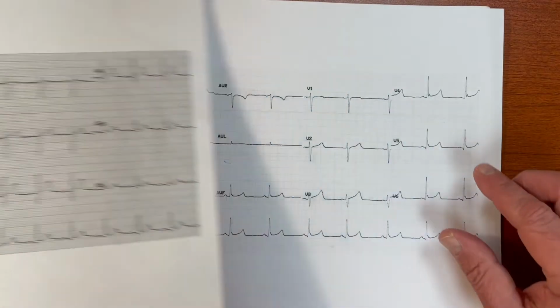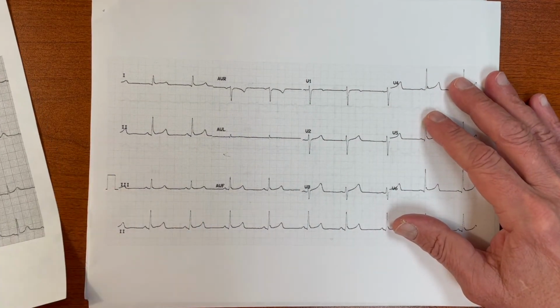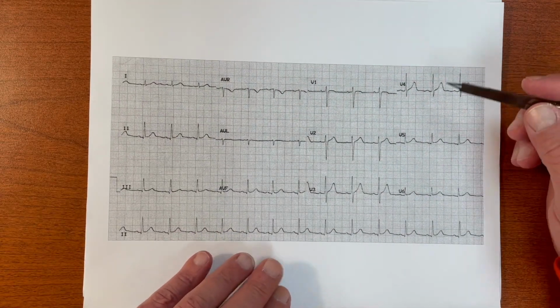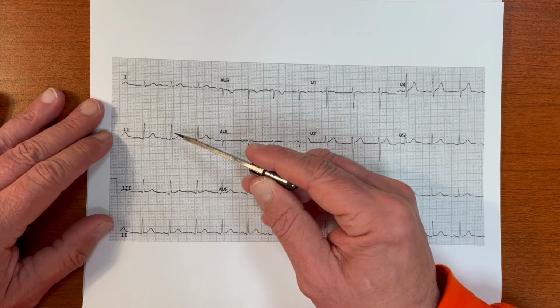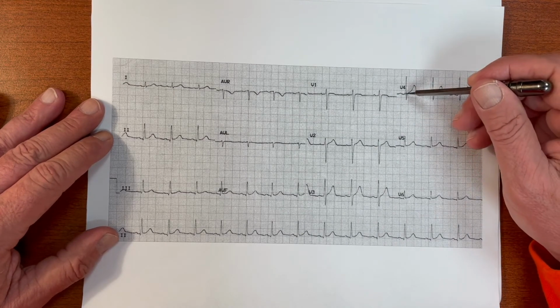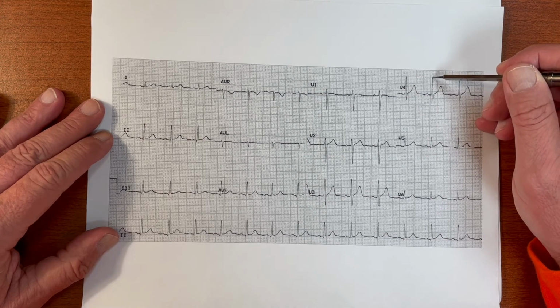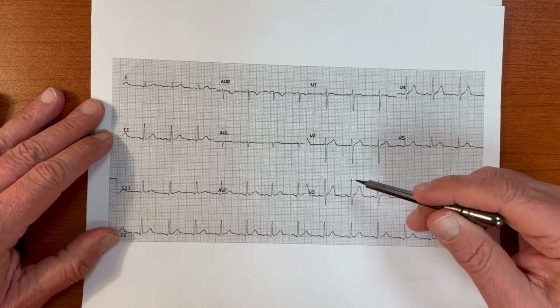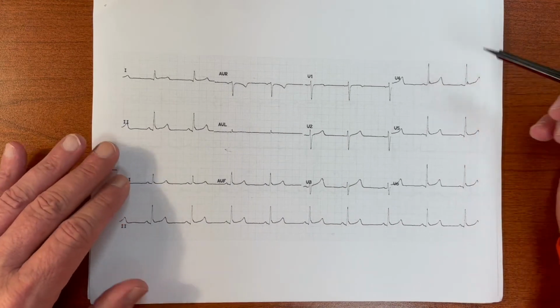All right? But there is an abnormality on this EKG that gives us an idea about what's going on. Here's a normal 12 lead, and let's just get a feel for the normal 12 lead again. Here my J point is pretty much equal with the PR throughout. The QRS, notice, looks nice and neat and discrete. Goes up cleanly, nice clean spike, comes down to an S wave, boom. Uniform and nice.